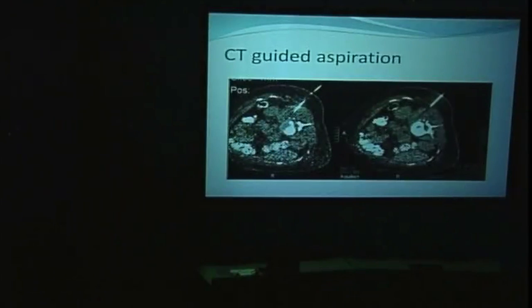And again, CT was used as a guide for a drain insertion.